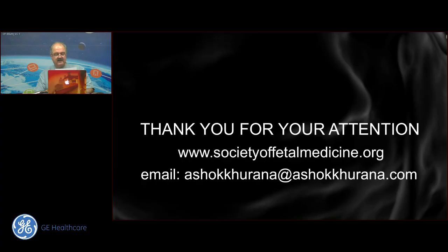Isolated bladder dilatation is better or worse compared to complete dilatation of the urinary system from a fetal perspective? Interesting. Isolated bladder dilatation, apart from our prognosis where we use 12 millimeters, 7 to 15 millimeters in the first trimester is what we call the type that we suspect a trisomy 21 strongly, and the one more than 15 we suspect obstruction strongly.